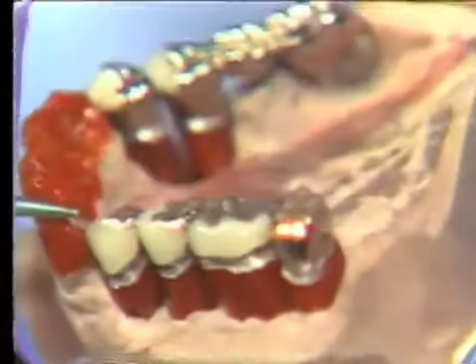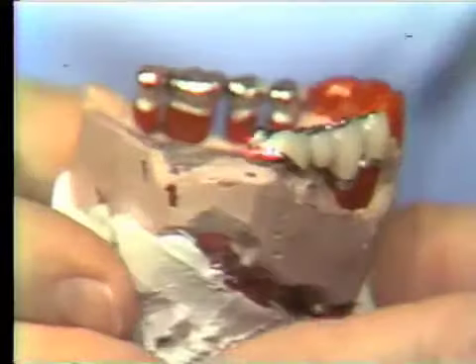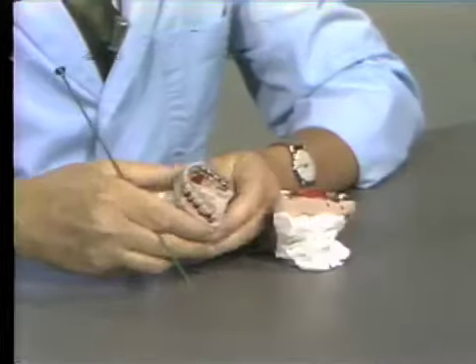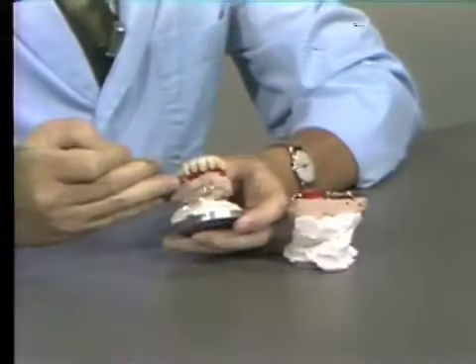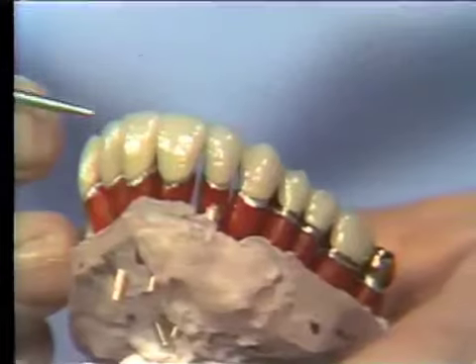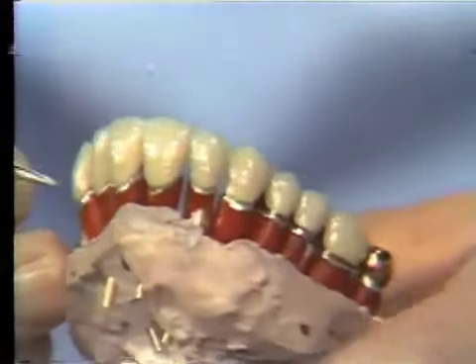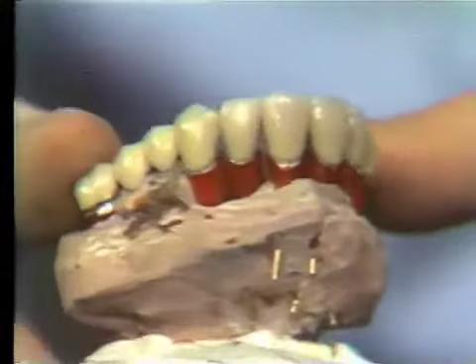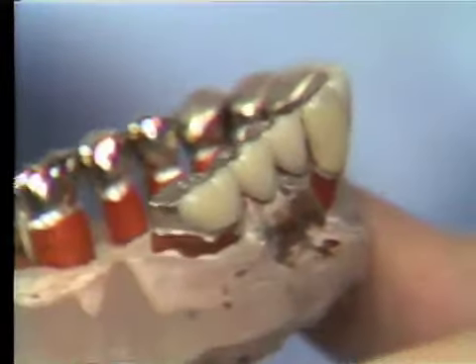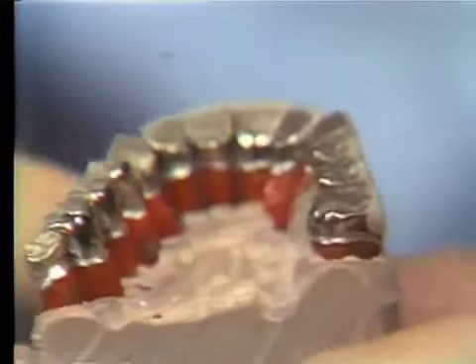Once we have all of the adjustments made, we would send back to the lab any soldering relations that need to be sent so that the lab can solder the bridges. Then we would have the laboratory technician go ahead, solder the bridges, glaze the porcelain facings, and polish the axial surfaces. We want the axial surfaces highly polished. The final aesthetic staining would be in the case at this stage. The case is all completed from the standpoint of the laboratory technician. The occlusal surface has been smoothened, but it comes back in a sandblasted condition so that we can now go ahead and work on the problems of the occlusion.